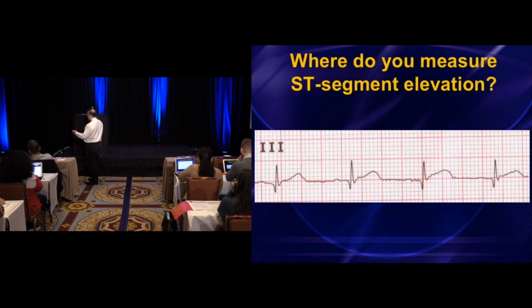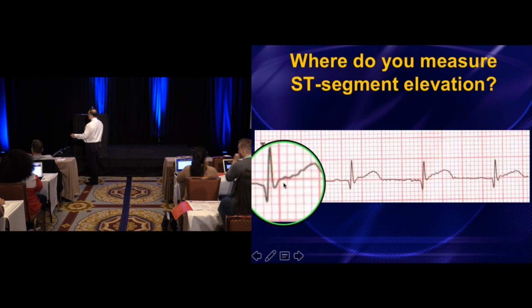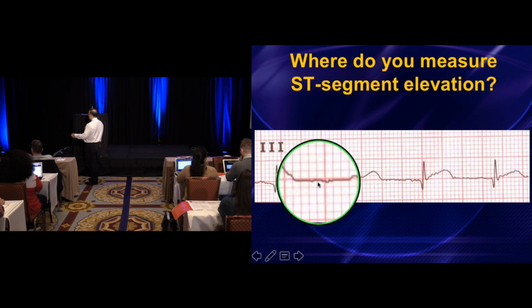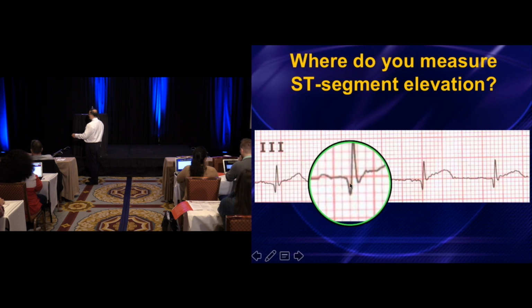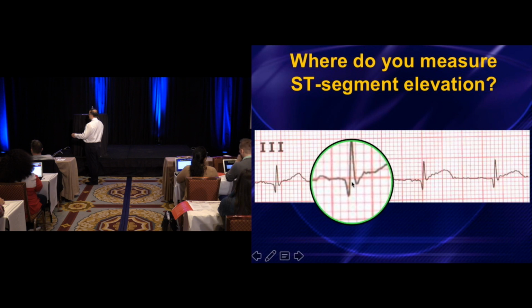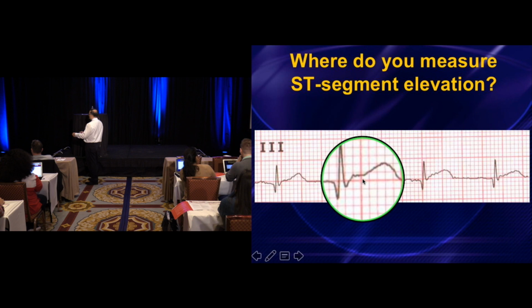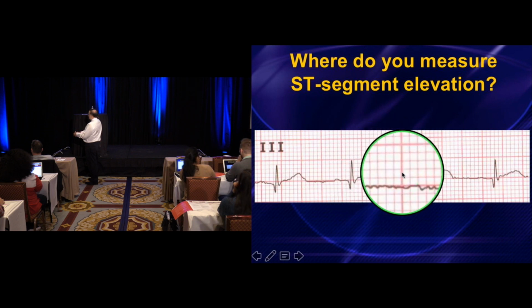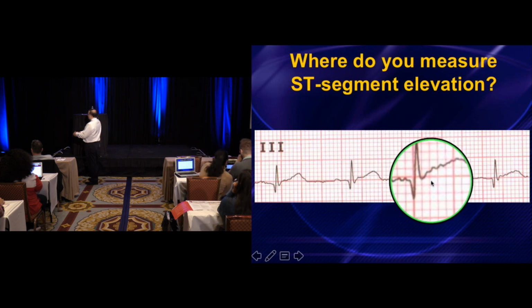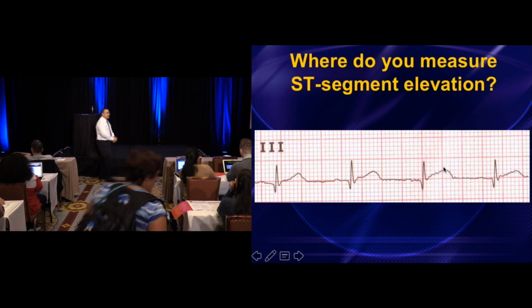I'll blow this up for you again. Is there ST segment elevation? How much elevation are you looking for? A millimeter? What about up there? Where even do you measure the ST elevation? Is it down there, or is it up top there? I've got just a little bit of a coffee tremor here. Let's stabilize with 2 hands, all right? And then over here, gosh, is that ST segment elevation? So it's not that straightforward, is it?